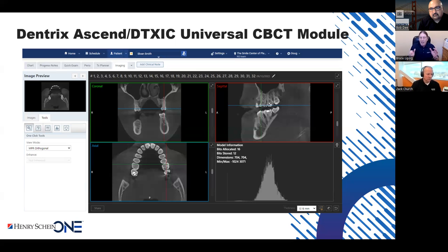One is that we want to keep the software itself really light so that it can operate on any PC. You'll know that the cone beam software that runs implant planning usually needs pretty high resources for the graphics and is pretty graphically intensive. We're running cloud-based software, and we don't want to force every one of the PCs in the cloud-based solution to beef up their resources in order to run implant planning that they might not even be using as a general practitioner.